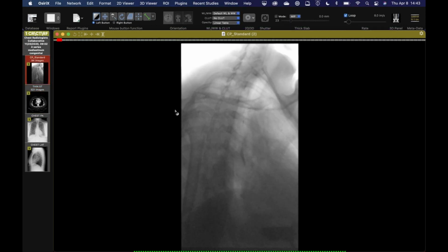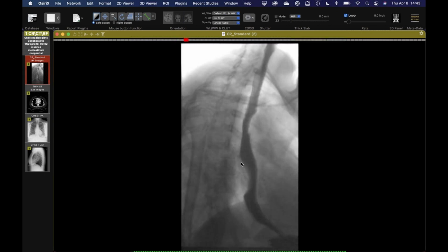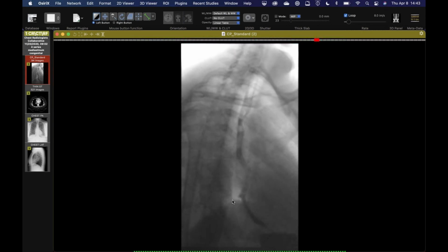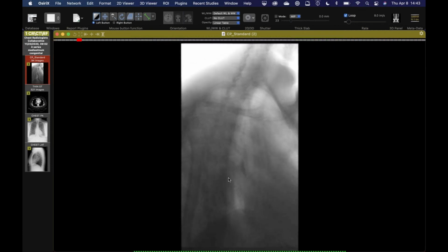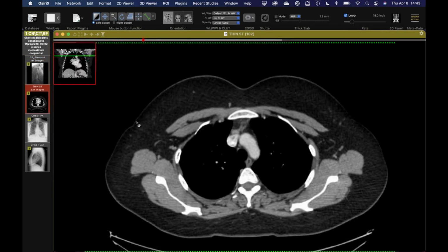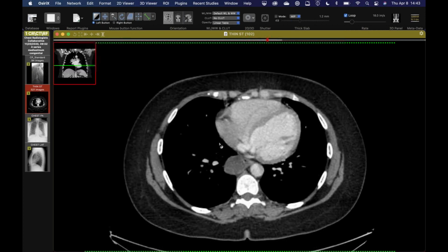And then a really nice esophagram image here that shows the fixed extrinsic defect with the obtuse angles, showing that it's not, well, we know from the CT that it's not in the wall, but if the patient had dysphagia or anything, you would know it was an extrinsic lesion. And so this was resected, and it was actually an esophageal duplication cyst, so it had esophageal mucosa.